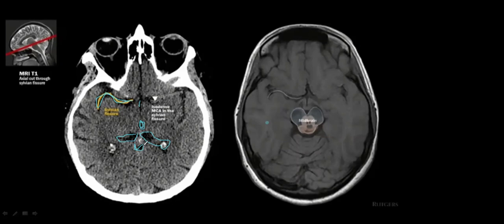We are at the level of Sylvian. We are at the level of midbrain. And is it possible that it is a fourth ventricle? The answer is no. When we are at the level of midbrain, posteriorly, there is some part of midbrain there. Look at here, this one.